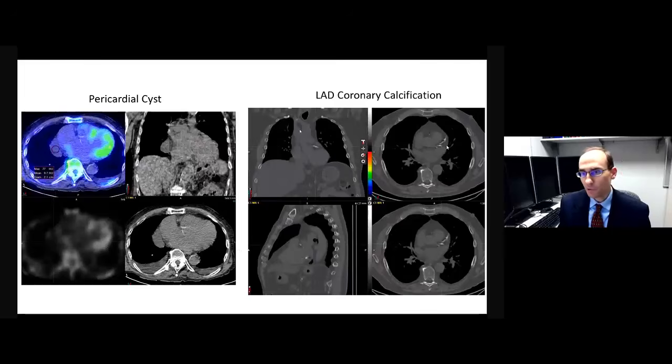As we talked about before, calcifications, and again, I think it's really important to put on your bone window for looking for calcifications. It brings them out a bit more. This is some pretty extensive calcification in the LAD.